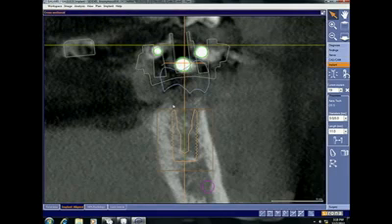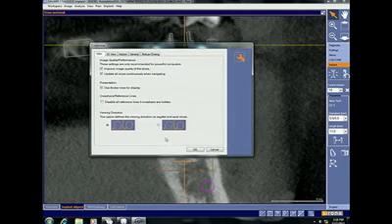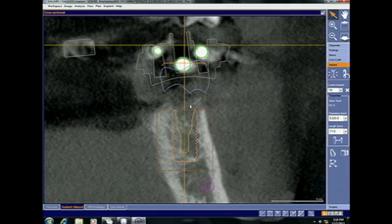Before I do so, let me show you what we're looking at here. We're looking at a cross-section of the implant. We're looking at the virtual restoration, which is outlined in blue. You're also seeing an outline of the reference body, but an important factor to notice is this orange line that comes directly perpendicular to the long axis of the line that extends off of the implant. This line right here is the top of the surgical guide, the platform of the surgical guide itself. And that's a distance from this line to the bottom of the implant of 21 millimeters. By the time I introduce a key on top of this, it'll be 22 millimeters, and that's how we calculate our drilling depth. Angulation will be completely controlled by the way that the CEREC mills this insert.